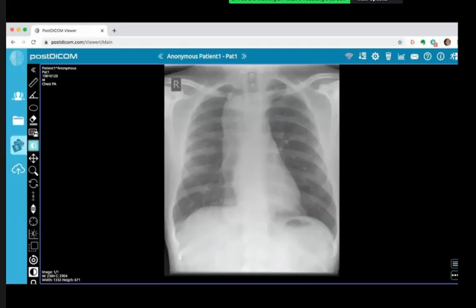Okay, so this is a frontal chest radiograph of an adult male patient showing a long, linear, well-defined opacity on the right side of the mediastinum, extending below the hemidiaphragm and up to the neck. This pattern is in keeping with dilated esophagus given the complaint of the patient.